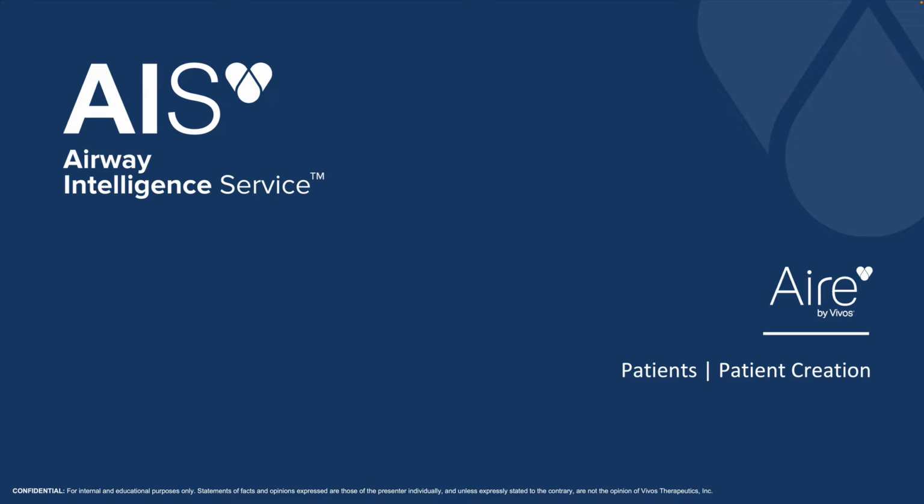Hi, this is Todd Huntsman, and today we're going to learn about how to set up a new patient in Vivos Aire.